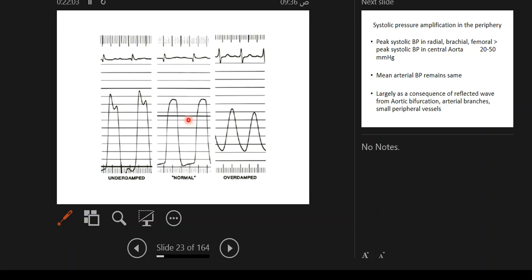This is an under-damped pressure, which we see sometimes in very rapid circulations. And sometimes in a patient like this, I will add a little bubble, so I will change it from an under-damped to a normal pressure. At least that's what Dr. Khaled told us, and it works.